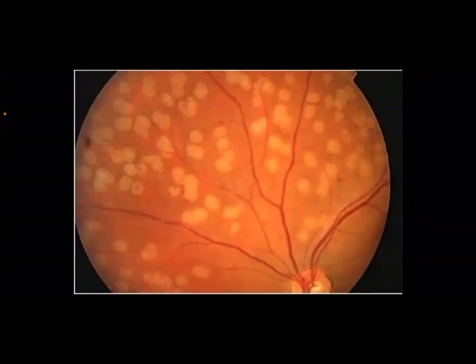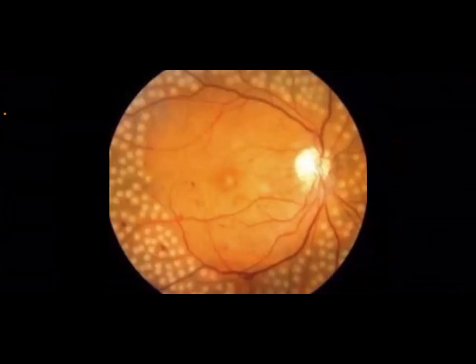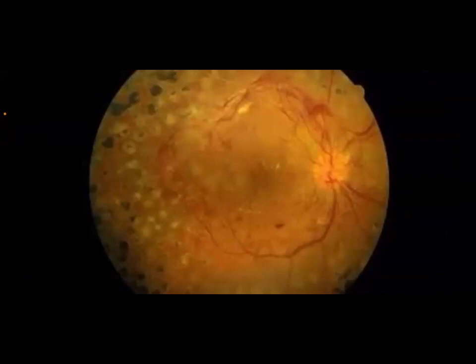This is again also laser therapy, peripherally. Yes, this is actually my case in the exam, looks exactly like this picture. There is laser therapy peripherally, but some of them look dark, black. Even some of the blood vessels looked black. But when I asked the patient about any previous operation, he told me, yes, doctor, I did operation. What kind of operation? He told me, I did operation for cataract. At this time, with exam stress, I forgot to ask him about laser therapy.